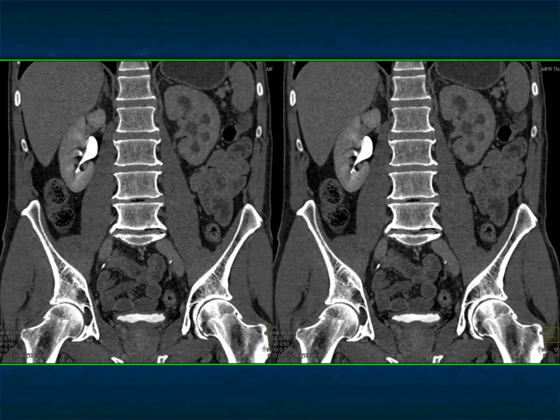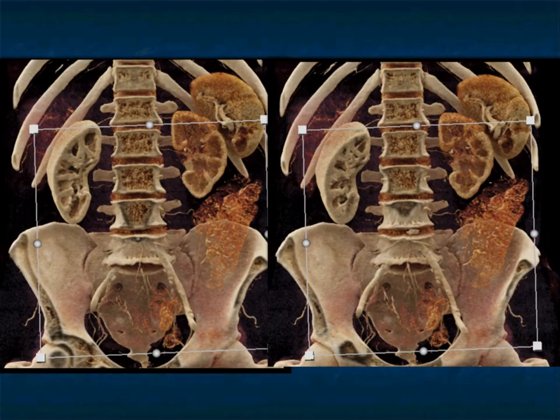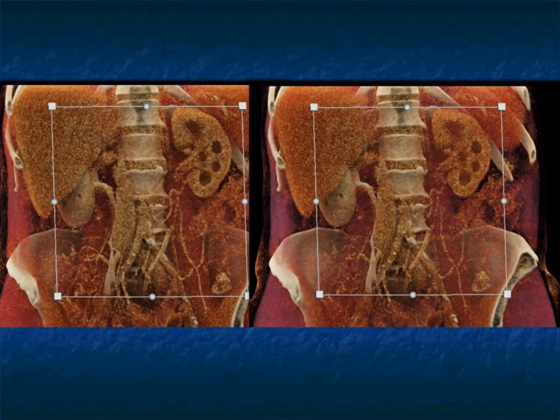Again, we talk about the different forms, mass-like. We talk about a small tumor in the pelvis, small tumor taking out some infundibulum or calyx, and this large infiltration. And again, here it is when we go to cinematic. And there's just a few nice cinematic rendered images showing the infiltration into the patient's left kidney. And again, the delayed function of the patient's left kidney. All very, very nicely shown in this example.